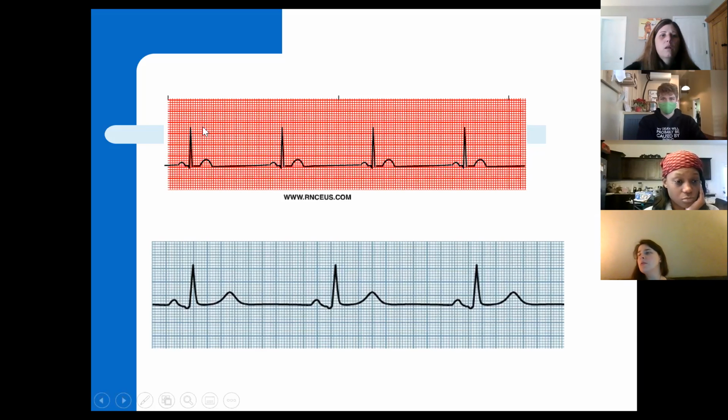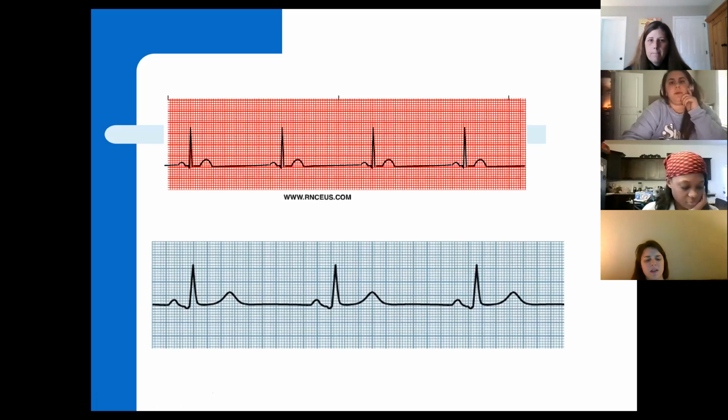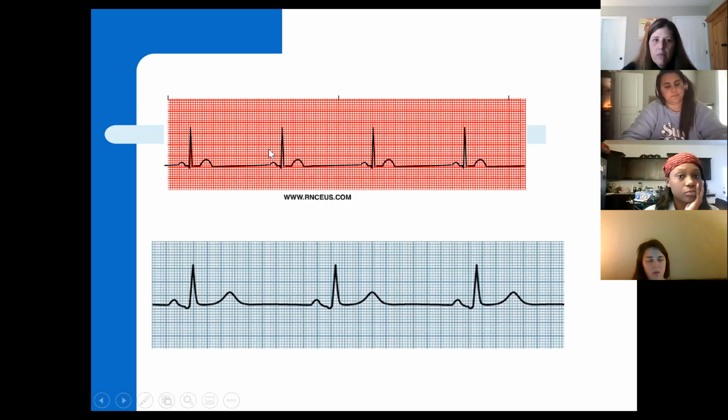There's 1, 2, 3, 4, 5, 6, 7, that falls almost perfectly, 8. So who's got out their calculator? 300 divided by 8. What is it? 37.5. Okay, thank you, Christy.